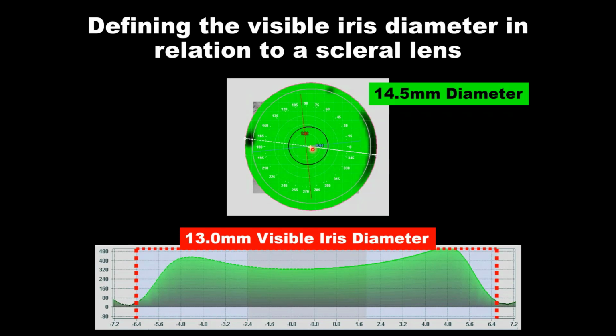We've placed our scleral lens on top of that topography. We show the apical clearance that we have. We show the increased fluid just in the mid-periphery. Then as we move toward the visible iris and the limbus, you'll notice that lens is coming crashing in to where the limbal stem cells are likely to be, or where the limbus is likely to be.